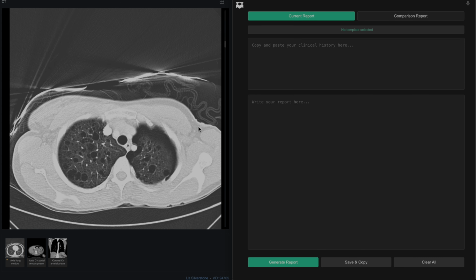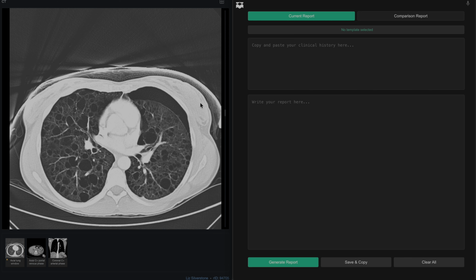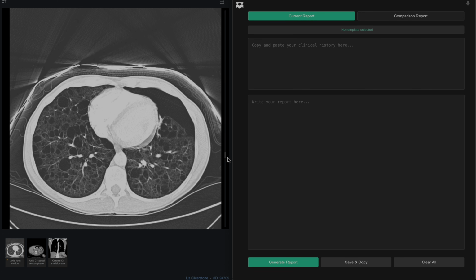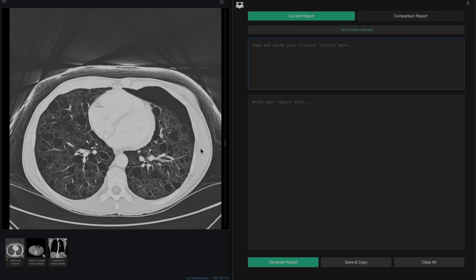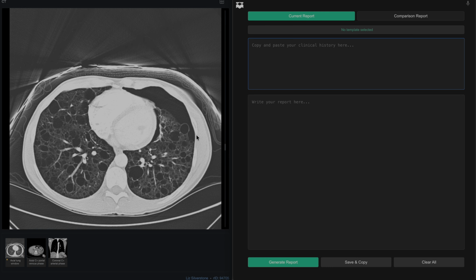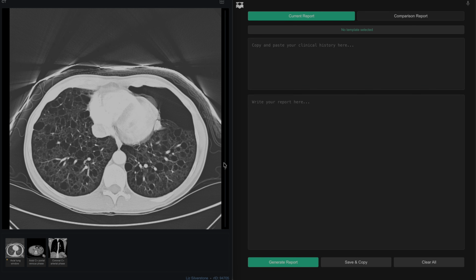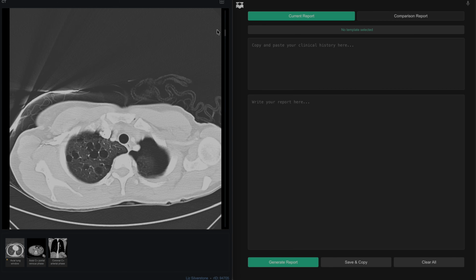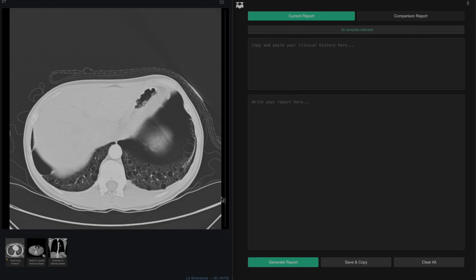Today we're looking mainly at this CT thorax, and this is a 30-year-old patient that's presented with chest pain and shortness of breath. We can see as we scroll through this CT thorax there are multiple thin-walled cysts. These cysts are seen throughout all lobes, with no real distribution in the cranial caudal dimension. There is a left-sided pneumothorax associated with this, no pleural fluid.